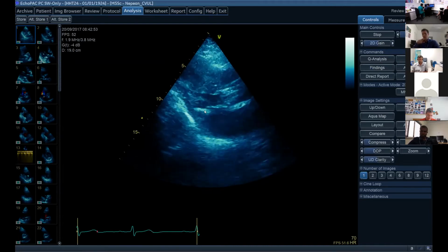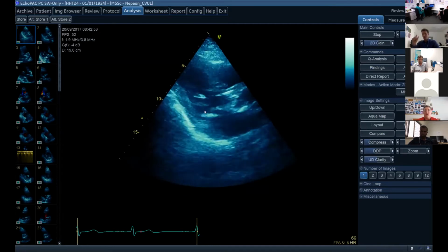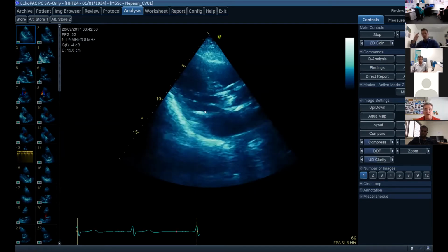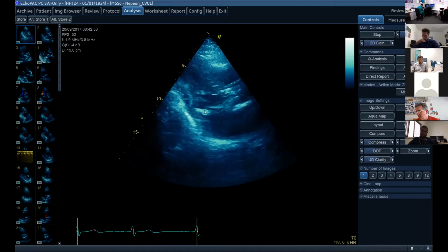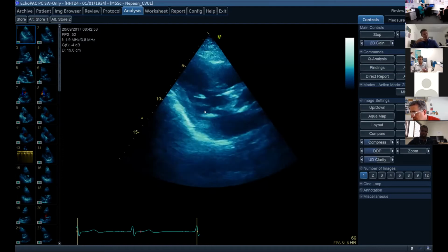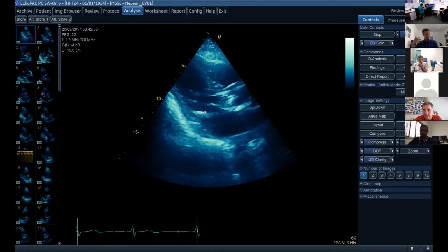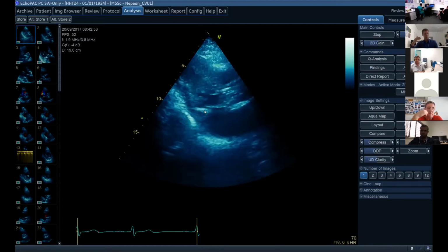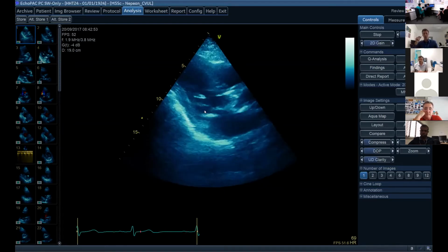Yeah, so it's not LVOT. If it's at the valvular level, remember, just trying to get the terminology nice. Aortic stenosis. Yeah, fantastic. So if you've got that calcification, we're probably looking at some stenosis. But also, what does the thickened LV free wall and enlarged left atrium start telling you? So it would suggest that there would be some diastolic, concentric hypertrophy. Yeah, nice. And I guess it's also that this is something that has been around for a while. It has built up over time. This is not something that's happened like that.